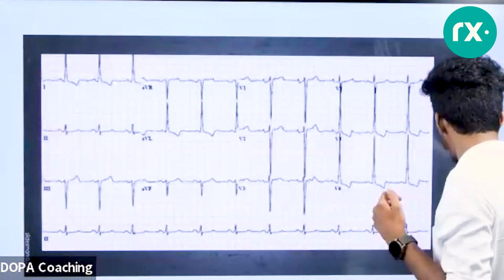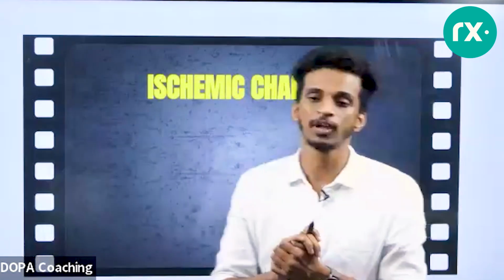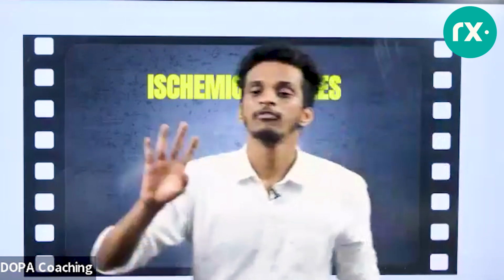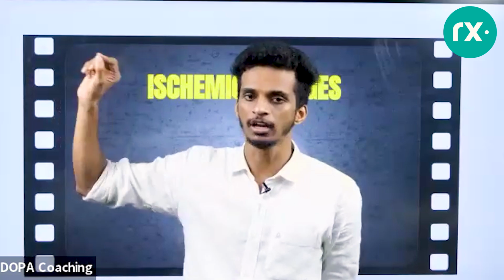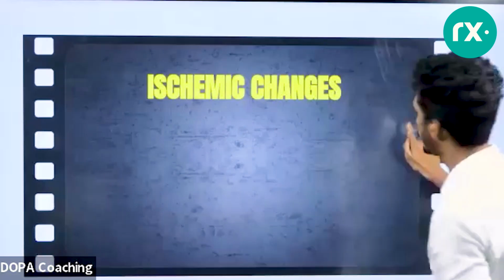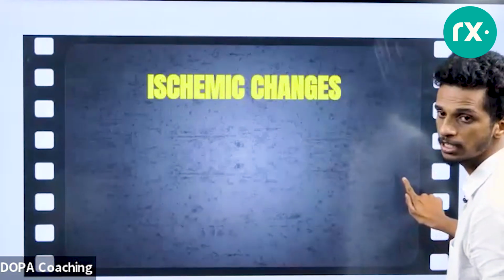The basics of ECG and the basics of ischemic changes, we have already discussed. That means we have discussed the leads. I am just brushing it up again. Which are the leads of the ECG we have dealt with? One, AVL, V5 and V6. Leads 1, AVL, V5 and V6 correspond to the lateral wall. I have shown you how to read an ECG. Lead 1 was here, AVL was here, V5 and V6 were here. That was lateral wall ischemia.